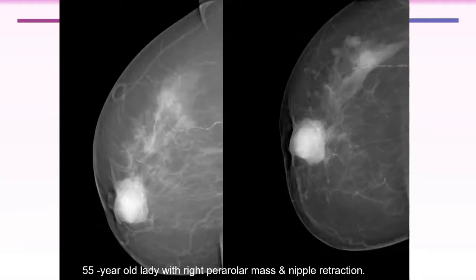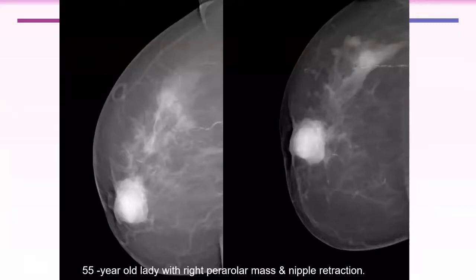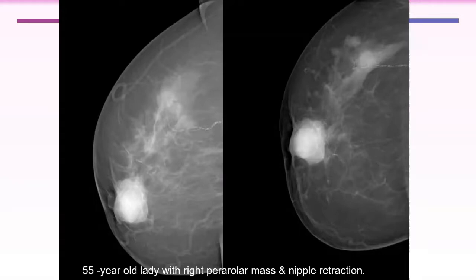Only inverted, or is there some associated thickening? Yes, thickening and retraction at the area of the areola only.